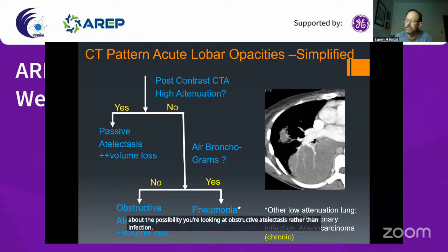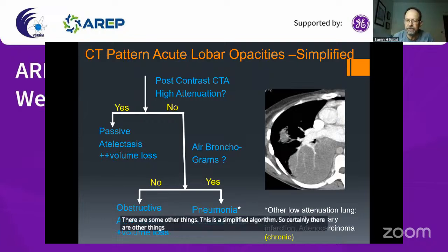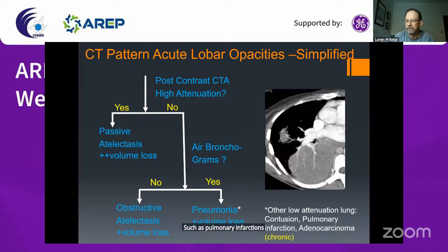There are some other things. This is a simplified algorithm, so certainly there are other things that cause low attenuation, such as pulmonary infarctions, or chronic adenocarcinoma, as pictured here on your right.